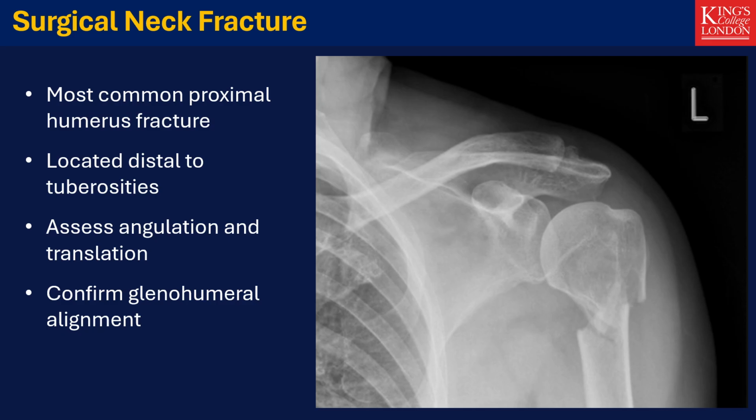Carefully evaluate medial cortical continuity as loss of the medial hinge increases instability. Displacement determines management. Fracture and dislocation may coexist, so alignment must always be assessed first.